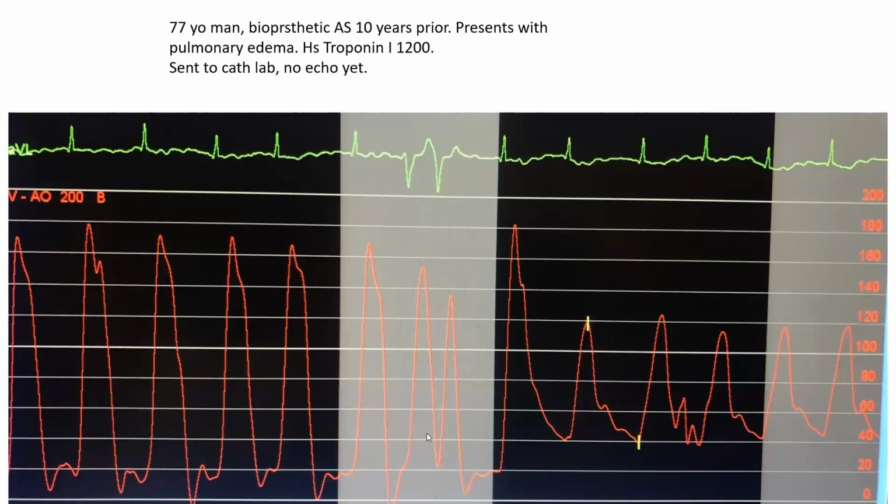What's the diagnosis here? There is a clear pressure difference between the peak LV and the peak aortic pressure. If you take really peak to peak, now this is not a simultaneous recording, this is a pullback recording, so there are downsides to that. It's hard to decide what to match with what. But normally the way I do it, highest with the highest and lowest with the lowest, LV with aorta, and you try to see the gradient for each one of those. In both cases it's really over 40, it's actually over 50 millimeters of mercury. This with that, for example, or this with that.